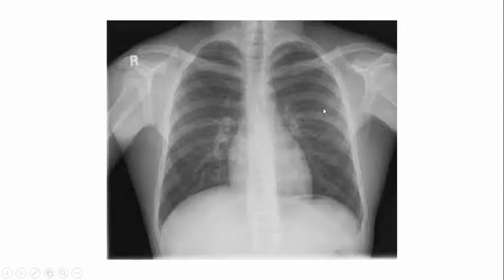And regarding the inspiratory effort, in a good inspiratory effort film, you should be able to see the 6 anterior ribs and 8 posterior ribs. Anterior ribs will be seen slightly in an oblique manner, and posterior ribs will be placed in a horizontal manner. So in poor respiratory effort, fewer ribs will be seen along the lung fields, and in cases like emphysema or COPD, you will be able to see more ribs in the lung fields.